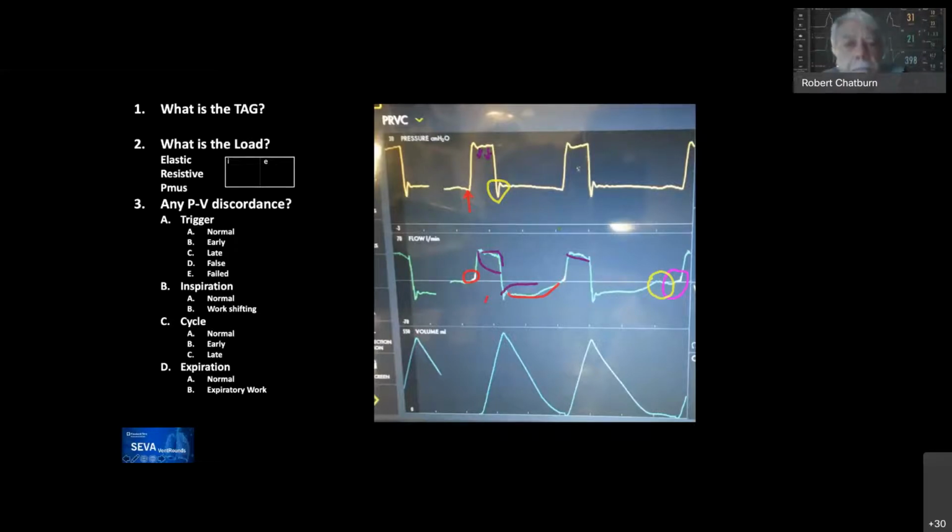Yeah, it seems pretty prominent. So if it's just ringing, then maybe that's what it is. You can see it in the flow too. And I think that may be another indication that the patient's still trying to inhale, right? The ventilator stopped giving flow, the patient's still inhaling, so the pressure tries to go below baseline, and it's all screwed up.